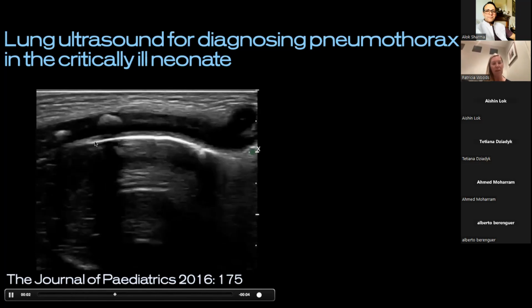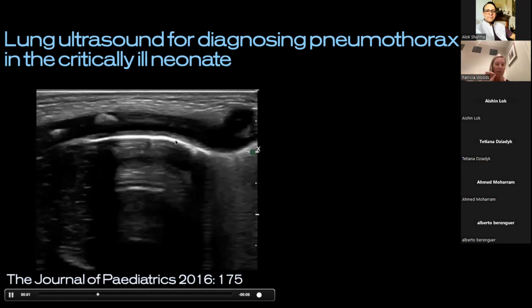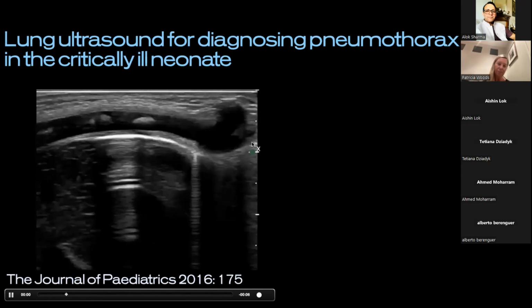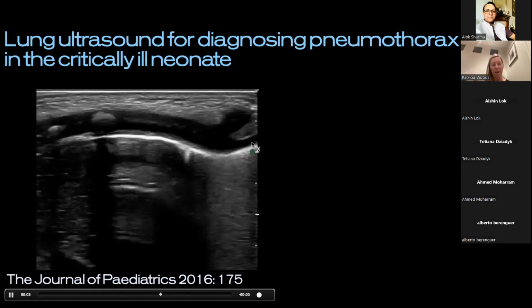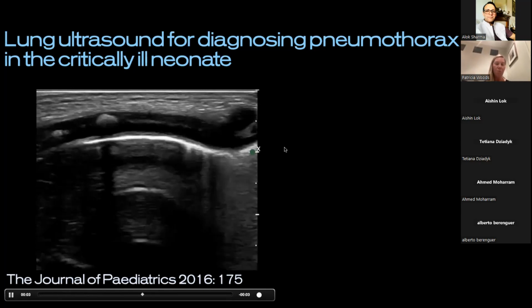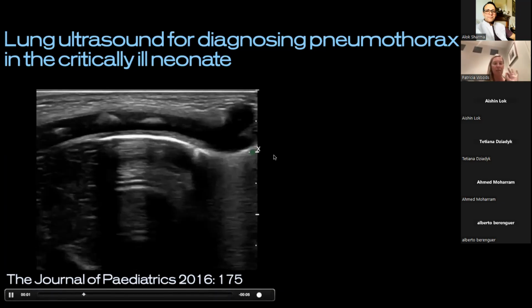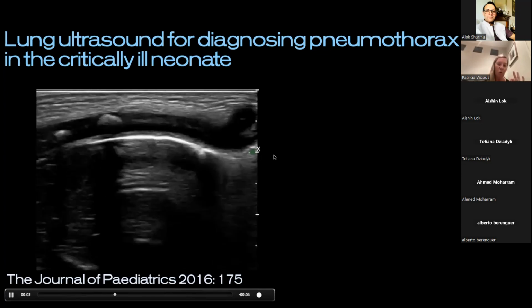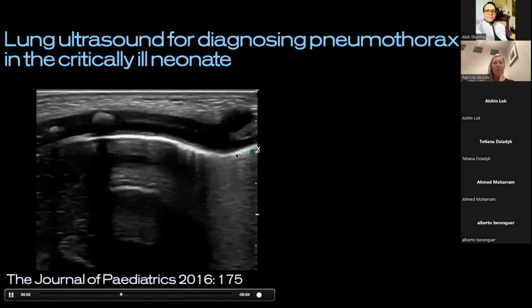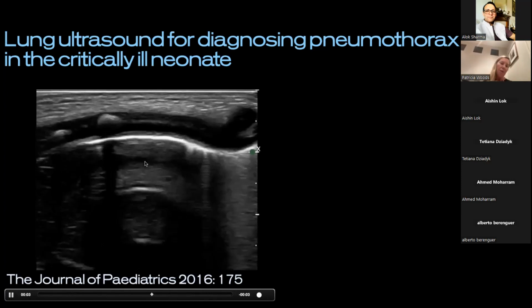And as you come along here, this pleural line, I'm sure you will recognize, there's a thin, white, defined pleural line that changes in nature as you're coming down the baby. And perhaps put those thoughts in your head of how you approach that description. Most would usually say, starting with the definition of the pleural line: is it well-defined, thin, regular, or is it more coarse, irregular, or disrupted? Then talking about movement observed, and then talking about the dominant artifact profile that you can see.